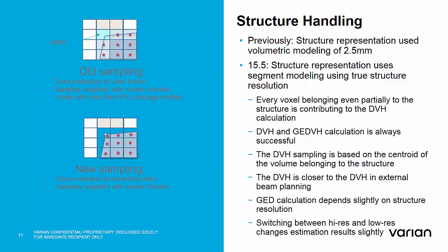The resolution set by the user is used. Note, this improvement is only used during re-extraction of older models and model applying with the new algorithm. The DVH estimation for structures may also vary depending on the structure resolution.